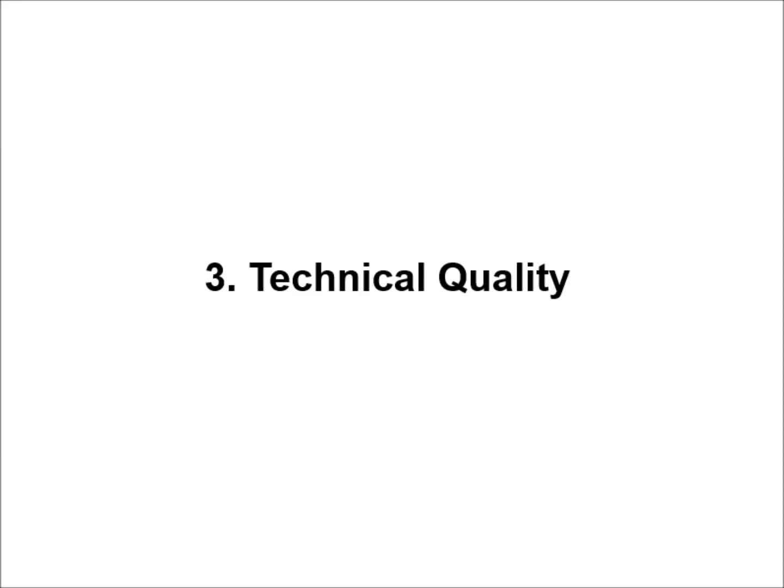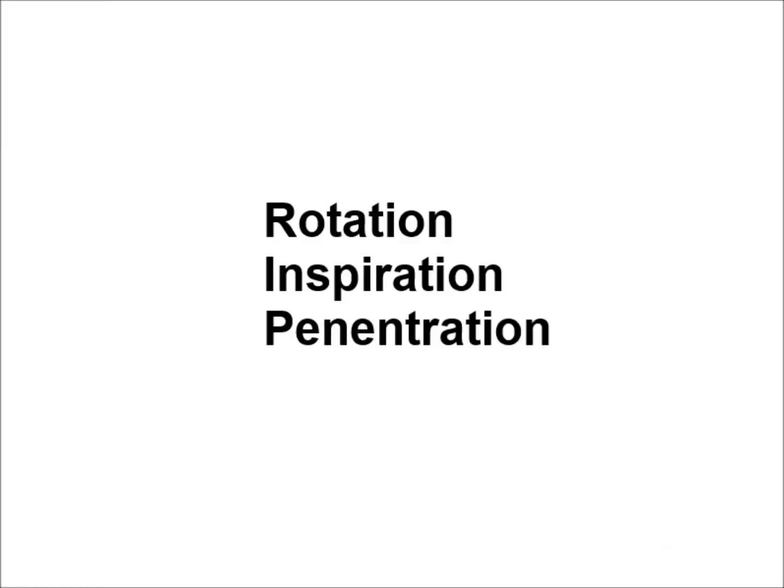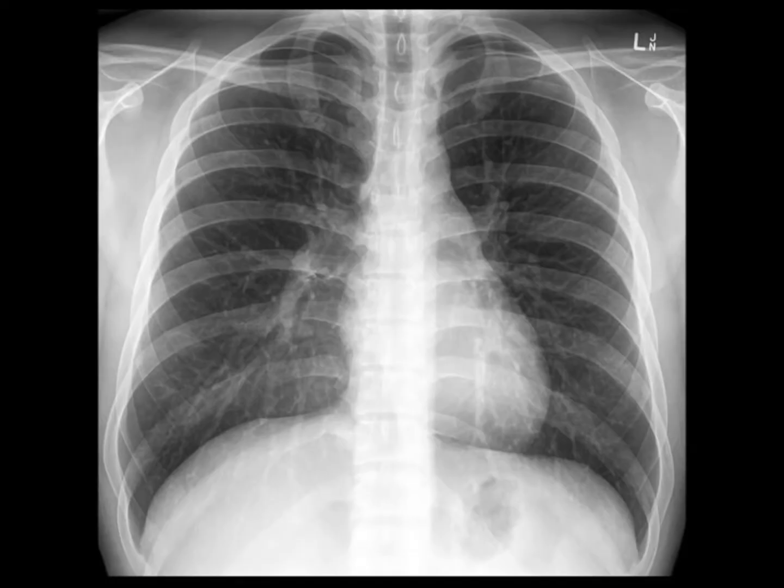A useful mnemonic to remember the 3 aspects of technical quality is R.I.P. Rotation, inspiration, penetration. To check rotation, look at the clavicular heads and spinous processes. If the spinous processes are halfway between the clavicular heads, the patient is normally rotated.